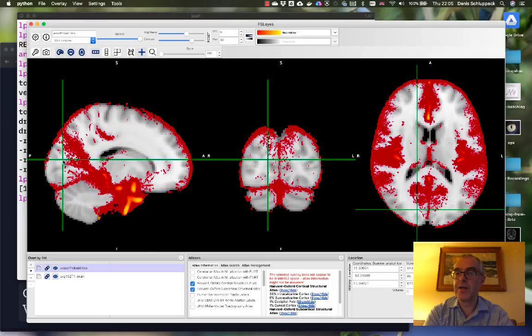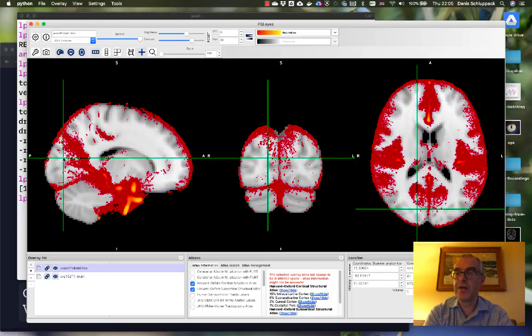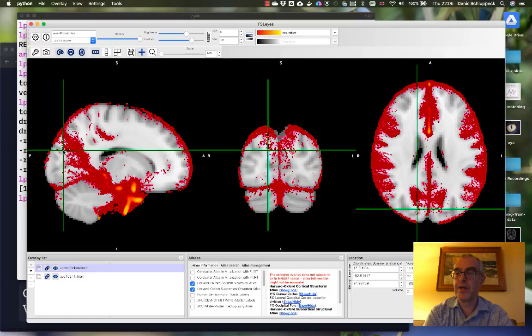So for example, one thing that I'm particularly interested in is the course that various branches of the arteries in the back of the head take in order to supply the visual cortex and the calcarine sulcus. Right, I'll stop it right here, and then in the next recording, we'll try and make use of this image information and try and visualize them using this vascular modeling tool.